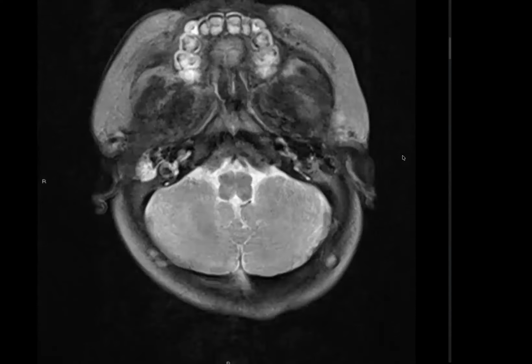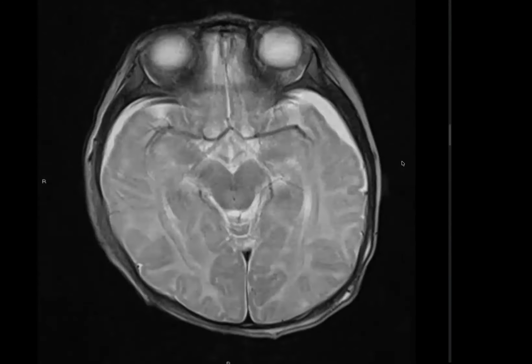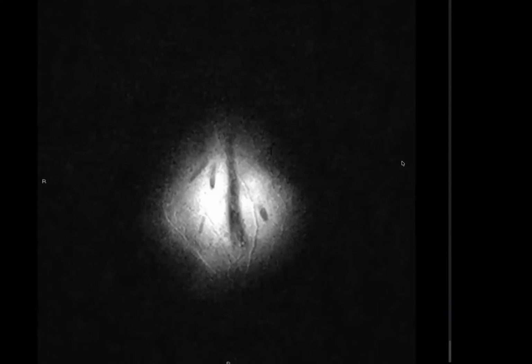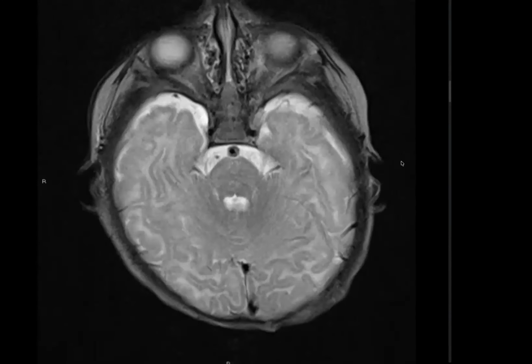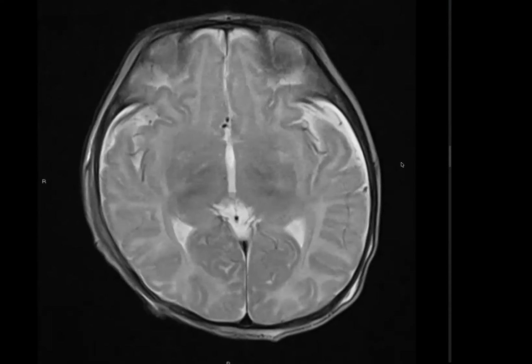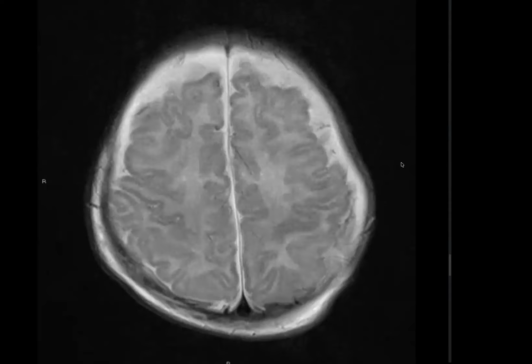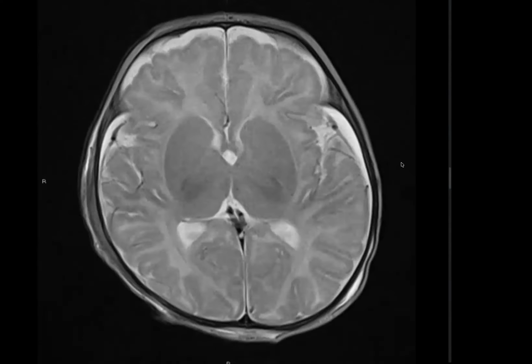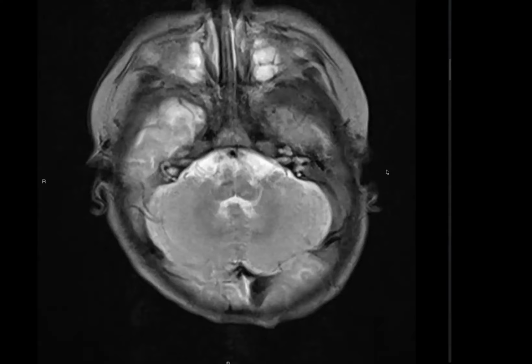And I can also see that there is subcutaneous edema in the left posterior parietal region, as noted in the CT images. So these look to be subdural hygromas to me. Chronic subdural hygromas to me.